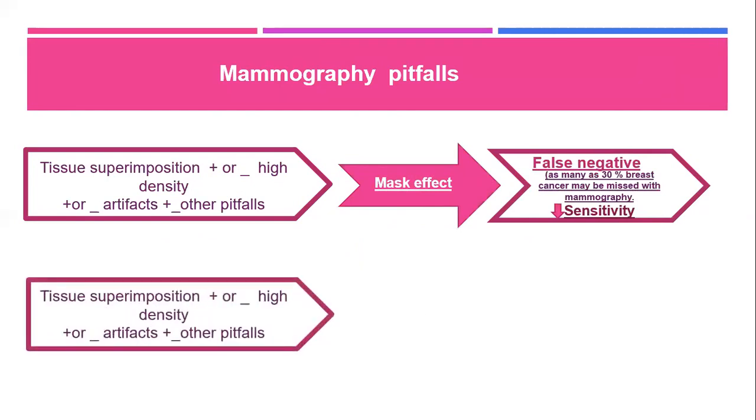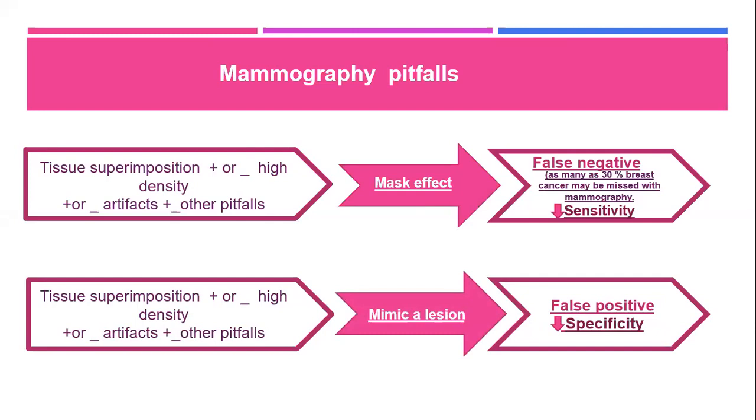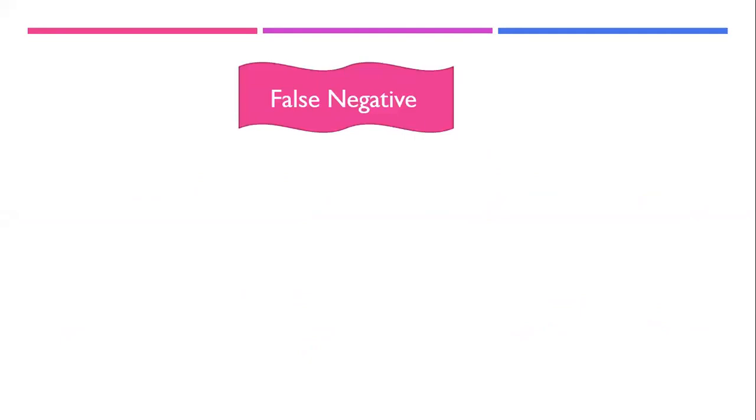The same factors can have a different effect, mimicking cancer lesions and giving a false positive, and therefore decreasing the specificity of the mammography.